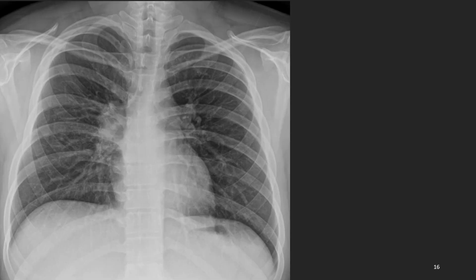This is the third case. What do we see? I'll be silent. Examine the frontal radiograph and imagine what the true result is. Please define the normal hilar structures. The left hilum is okay. The right hilum shows blah blah blah.